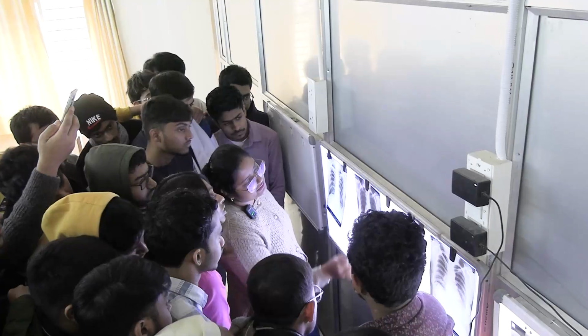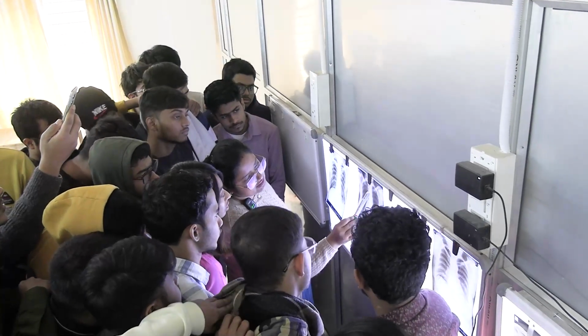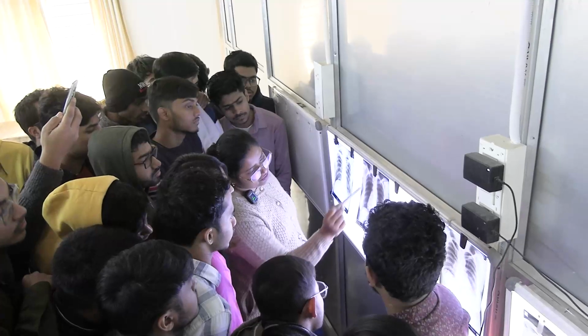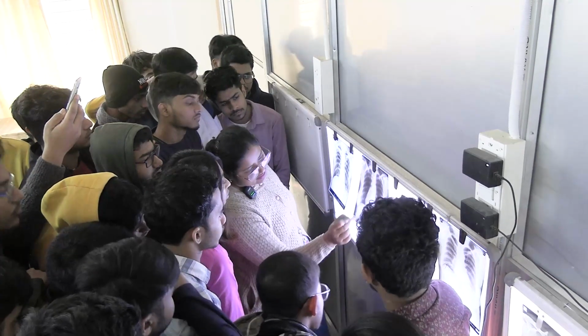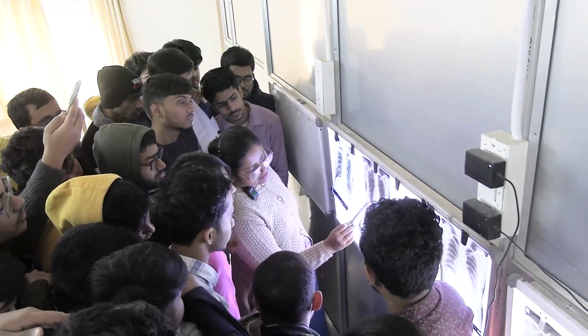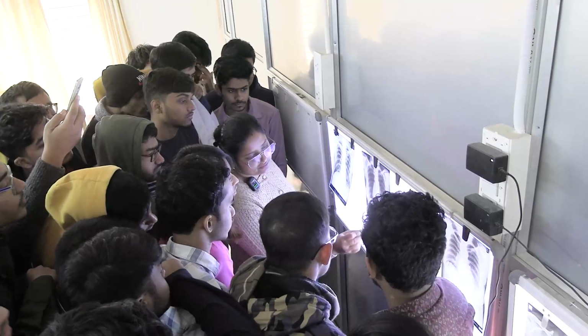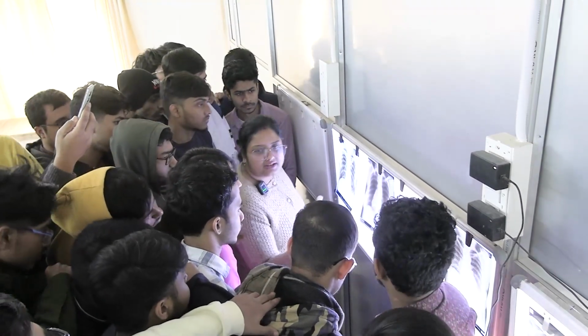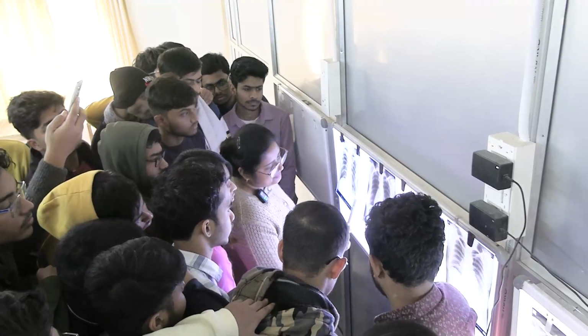So: vertebral bodies, spines, tracheal shadow, clavicle, scapula, rib shadows, bronchovascular markings, heart shadows. You can see the right dome is higher than the left dome. A fundic gas shadow and markings are there. So there is no collapse in the lung.